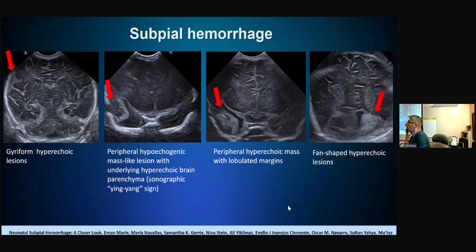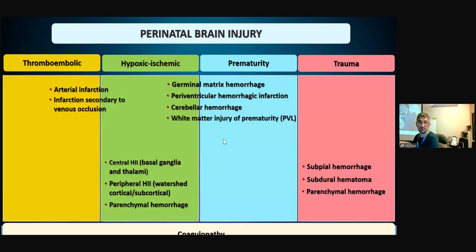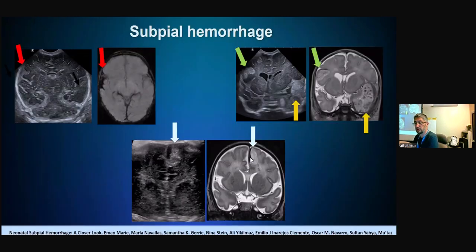How did they confirm that it was subpial? Was it through pathologic analysis or? No, based on MRI. So for example, here, these are the correlates. You can see this, right? Not on a daily basis, but in research, it's controversial when they do the histopathology. They claim that it's subpial because it's under the pia mater, but some authors mention that there is no such space.